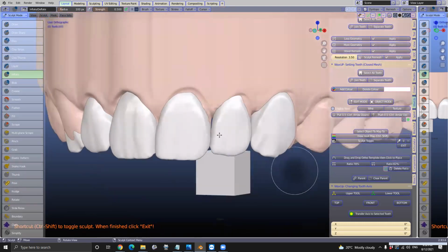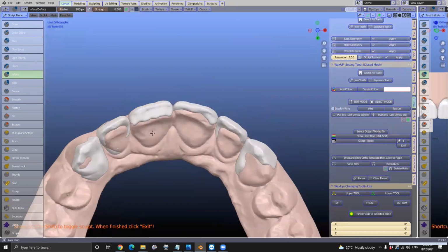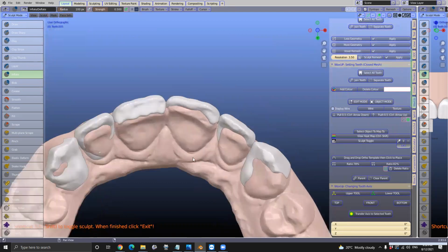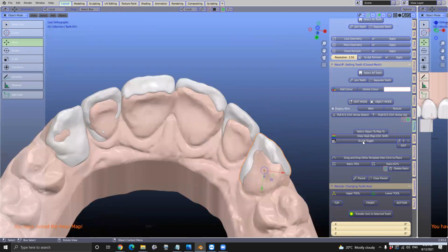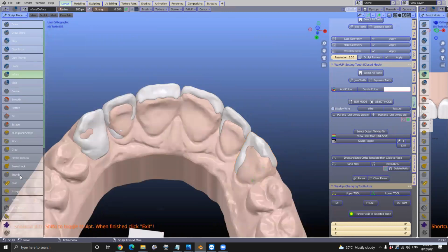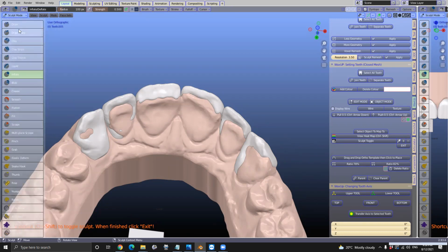So we've got to be careful with the sculpting, but I think it's just a matter of practice and knowing what the sculpting tools are. Because when you go into the sculpting tool, the menu has so many things. What I mostly use is simplify, which simplifies the mesh structure. And then we've got inflate and deflate.